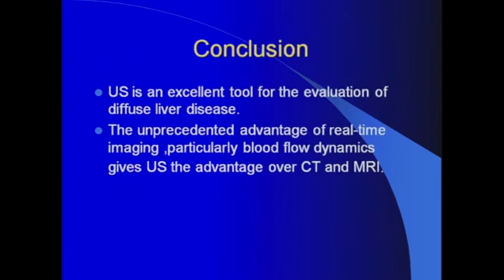In conclusion, as you can see, ultrasound is an excellent tool for the evaluation of diffuse liver disease. It still has the unprecedented advantage of real-time imaging, particularly blood flow dynamics, which gives ultrasound the advantage over CT and MRI.